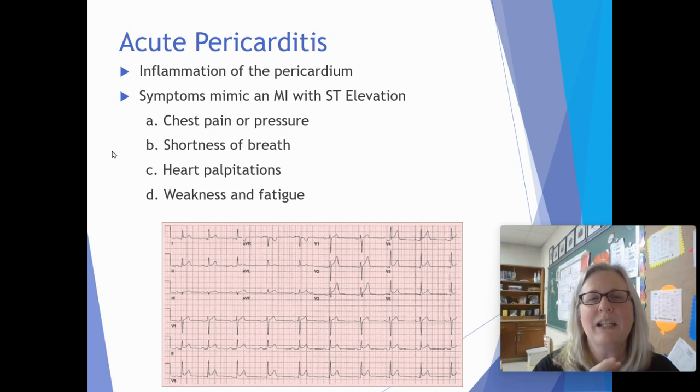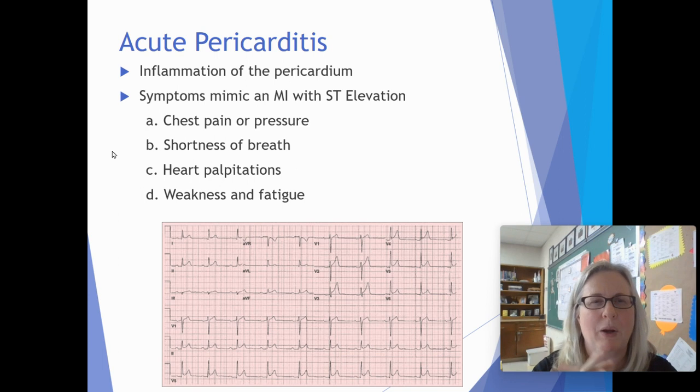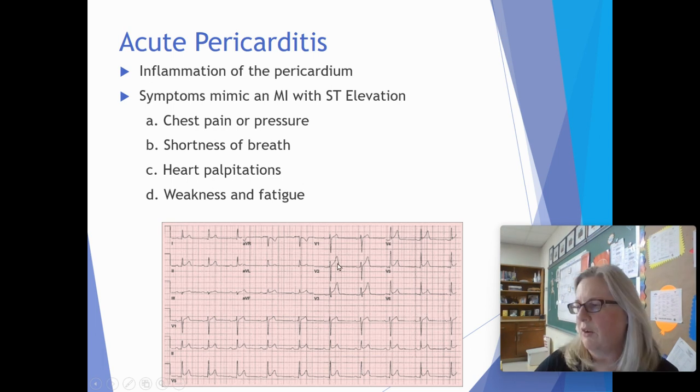Yes. Again, we see this more in younger patients. So I don't see pericarditis as often in like the 60 and above range, but I do see it in that late 20s, early 30s up to 40 aged people that have pericarditis that feel like they're having a heart attack but aren't really having one. Okay. You'll still see some changes on the EKG occasionally here. You can see it looks very funky here. Some ST elevation here in these leads, in these anterior leads, specifically the anterior leads.